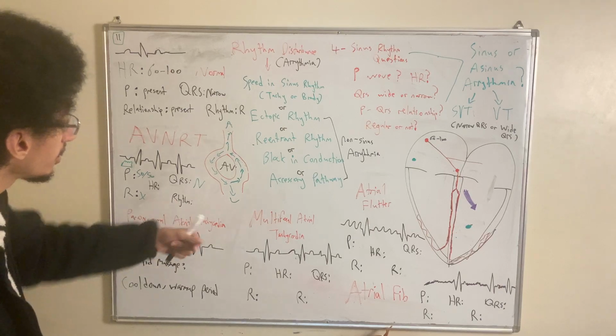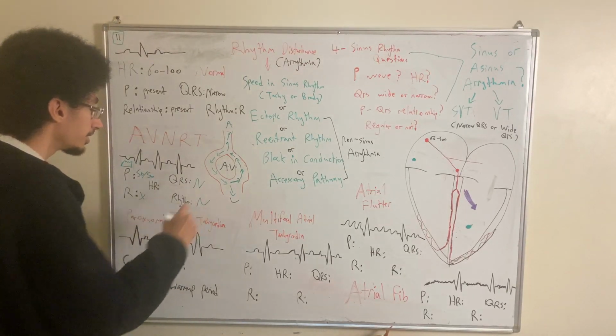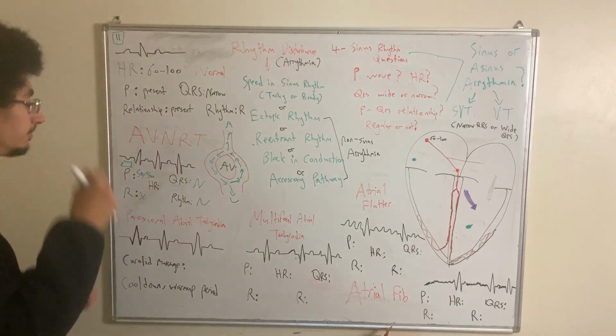And then the final question we ask ourselves: what about the rhythm? Is the rhythm regular or irregular in AVNRT? The rhythm is normal, meaning regular. It is a regular rhythm for AVNRT.